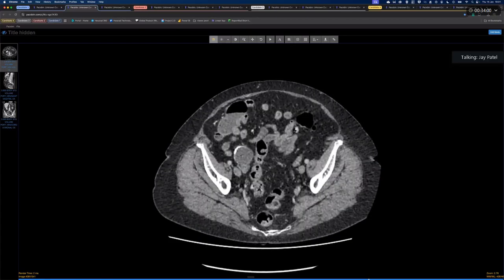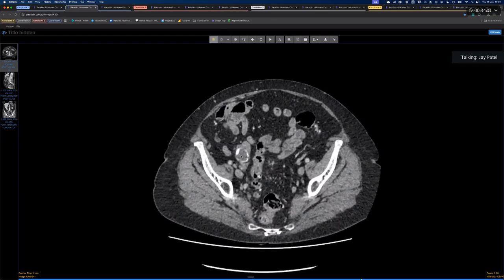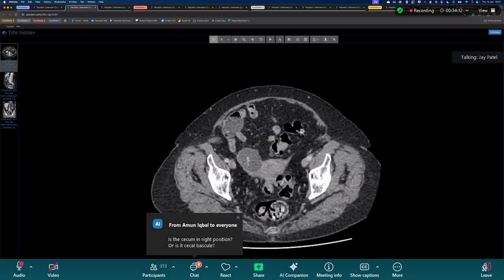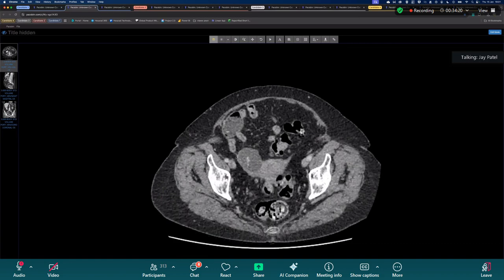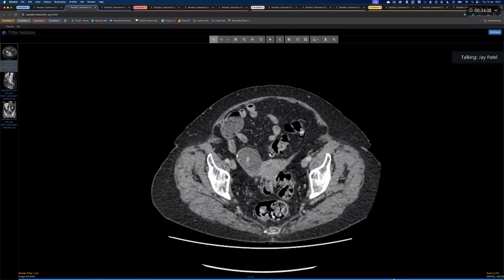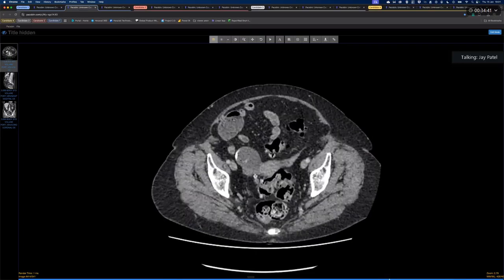Okay. So appendiceal mucoceles typically have calcium in them, typically dilated, typically low density. Another kind of phraseology that people might use for this is an LAMN, a low-grade appendiceal mucinous neoplasm. These can exist sometimes quite indolently, and by that I mean you might see them incidentally in a patient for another reason. The patient's pain has almost certainly nothing to do with this, but they are either malignant or pre-malignant and do need resecting to reduce the chance of disseminated malignancy.